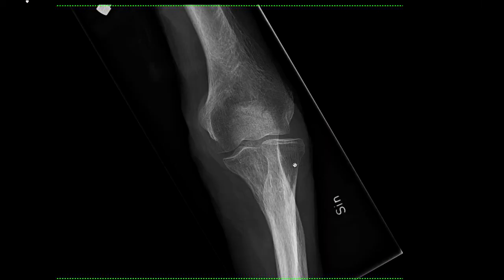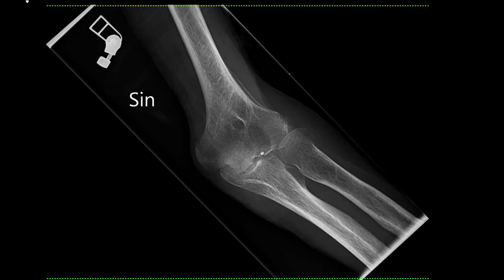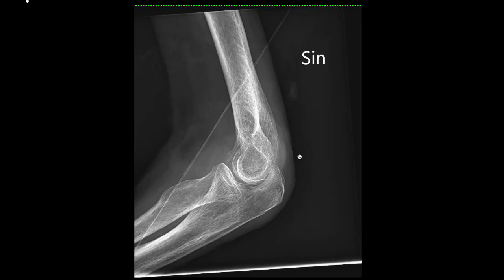So guys, another patient for you. Also very old patient. You see the cortex is really thin. She also fell and hurt, really painful in the elbow. When you look, you try to look, but you don't see anything. And this picture is really badly taken, so you can't really decide if there's an effusion or not. And I was really close to miss this one.